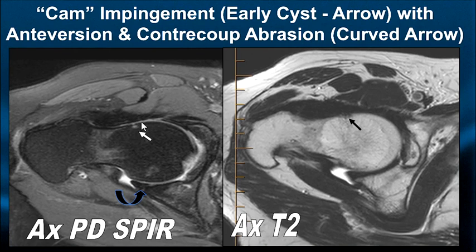Now, here's somebody that doesn't have a bump, but they're not really tapered. Yet they have this thing called a herniation pit, which Toddy and Murphy described in 1990 in the Yellow Journal, which I said half the articles are useful and half not. And they said, it's a herniation pit. It's an incidental finding. It's of no consequence. It should be differentiated from an intraosseous ganglion. Well, guess what? It is an intraosseous ganglion. It's a sign of cam-type impingement. Just didn't know it at that time. So the article was completely off base.